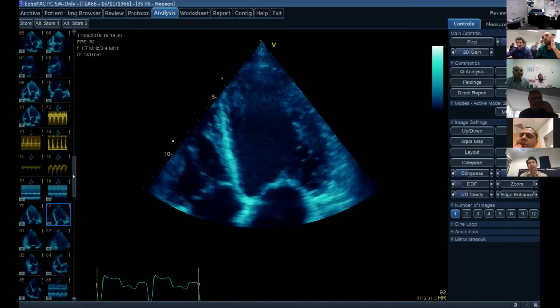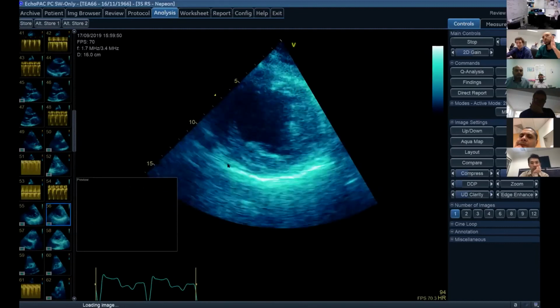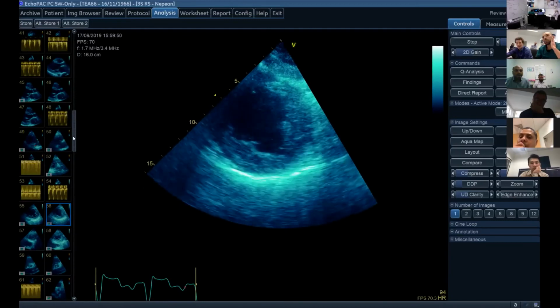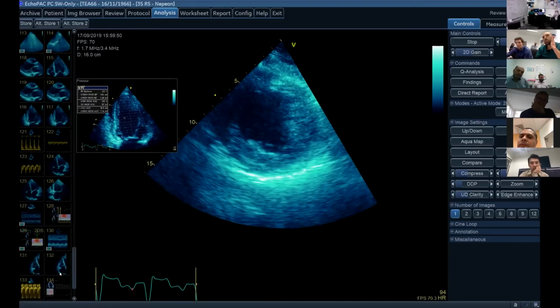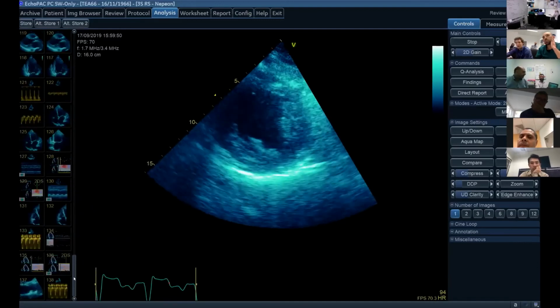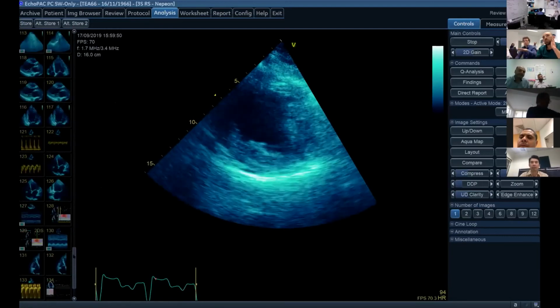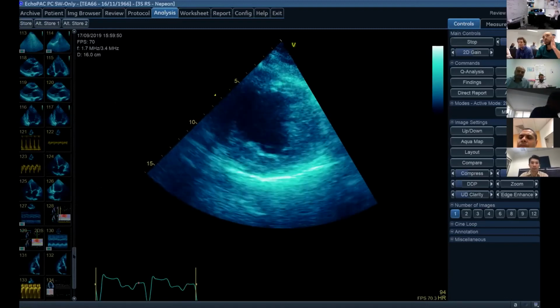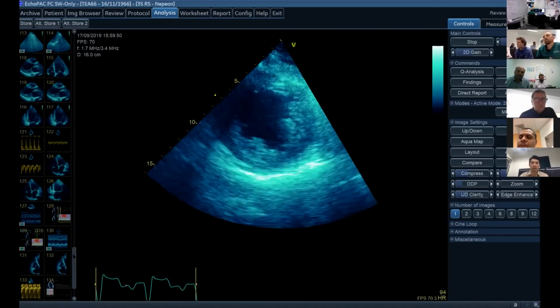If I'm in the exam and I want those extra marks, I could talk about how I obviously use my short axis view as my go-to view because it's hardest to mess up. But if I'm finding it difficult, don't forget that you can get it from your subcostal view, if you're trying to use all available resources. The short axis on your subcostal view with some off-axis imaging. Okay, nice one. Thanks very much for showing us that case. So that brings the DDU teaching to a close.